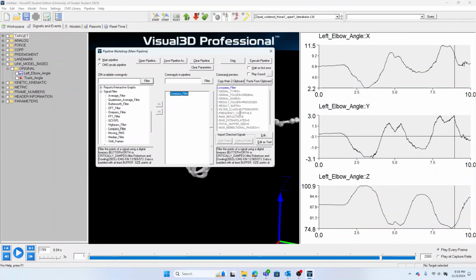Okay. Now, this is waiting for us to choose the destination, essentially where you want to apply this filter. So I'll open up this targets, and then I'll select original. I'll click here and I'll click original.